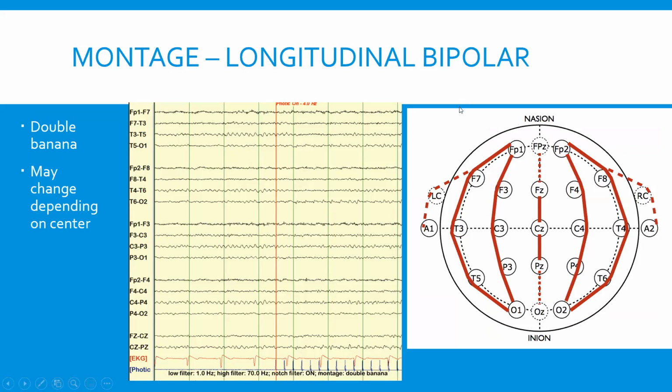So, as I'm trying to explain this, I realize this sounds really complicated, so please feel free to stop me. All right, so just remember, this first set is called the left temporal chain. And then here is a central chain, right?